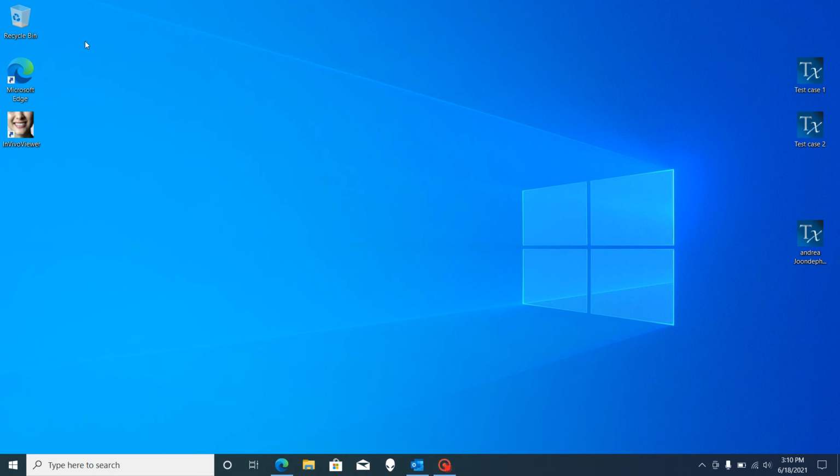Hello, this is Andrea from Dental Facial Imaging Northwest, and this is just a quick tutorial on how to receive your CBCT scans through the Anatomage Cloud.